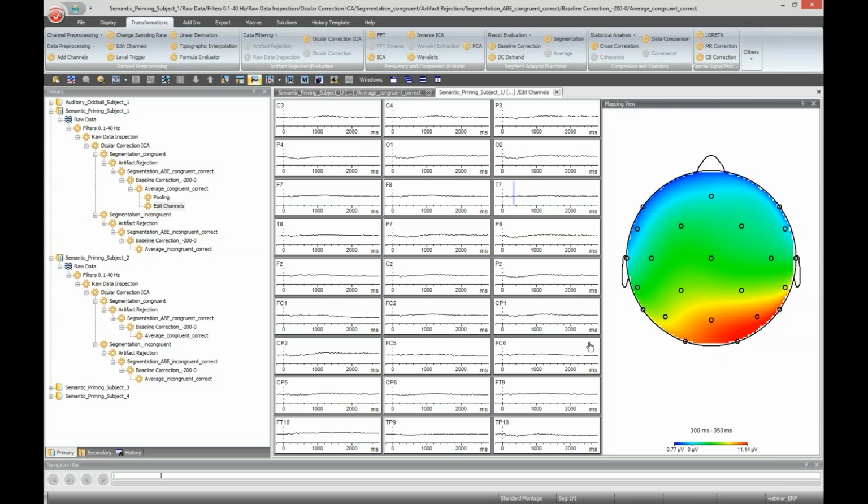Therefore, if you are interested in the end to analyze only the results of your ERPs in a few channels, and you show only these channels as waveforms, still create your mappings based on all channels. Do not take out all other channels and create the map just on those. It will definitely alter the map, and it will not give you the real distribution of voltage across your whole measurement.